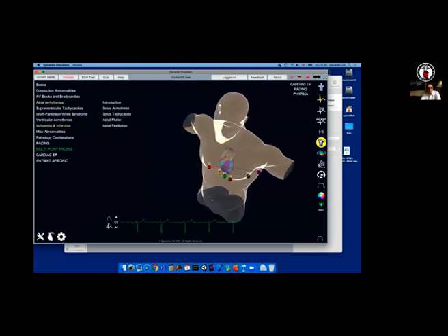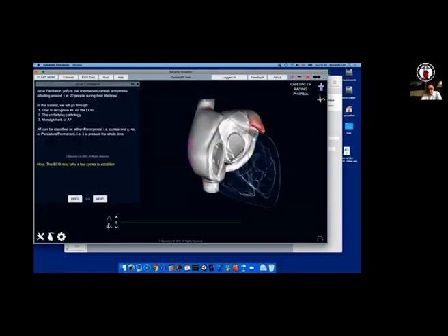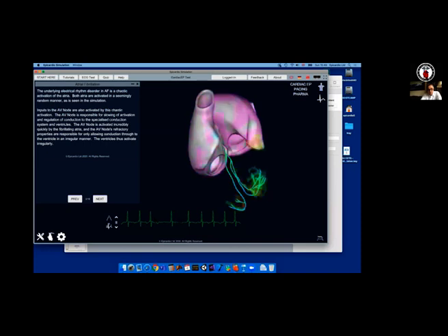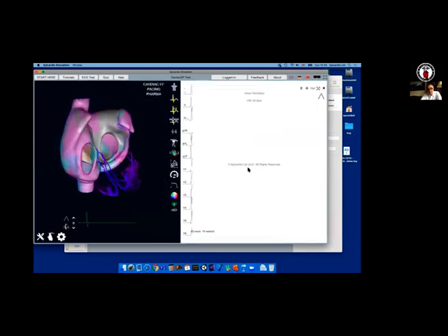So let's look at the classic atrial fibrillation. Here we see the atria and the fibrillation appearing, and we see the lead 2 ECG. First of all, we see noise on the ECG baseline, and we have an irregular rhythm. We can look at the 12 lead again, and we can confirm the classic view of atrial fibrillation.